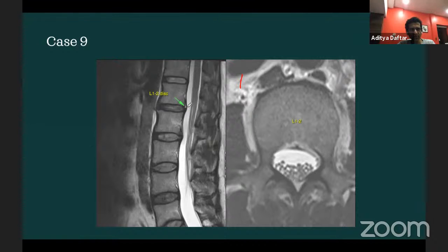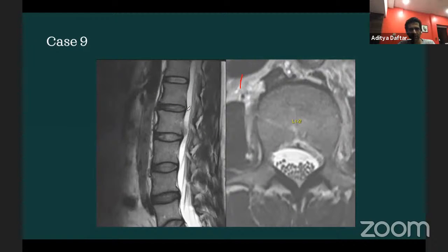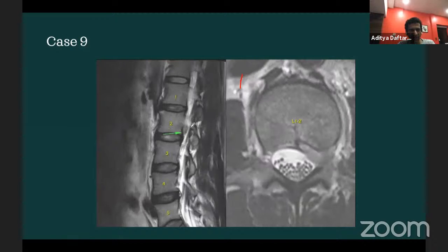So this is one where you see this L1-2 disc, you think there's a small disc here, you start scrolling through this, and as you keep coming down, oftentimes you've got to look very carefully on these sagittal images, because if the tech also didn't see it, they didn't get axial images, we tend to get images like this at this level, then at this level, then at this level. So if they didn't see it on the sagittal images, you might miss this extruded or sequestered disc, which you can see right here. So remember to look carefully at the parasagittal images for extruded and sequestered discs.